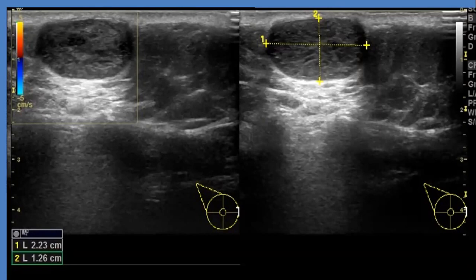Because there is a limited differential diagnosis, and it is almost always benign etiology, including mainly two differential diagnoses: sebaceous gland lesions, like sebaceous cyst, and more common than sebaceous cyst is lipoma. In the hypodermis, the commonest is lipoma.